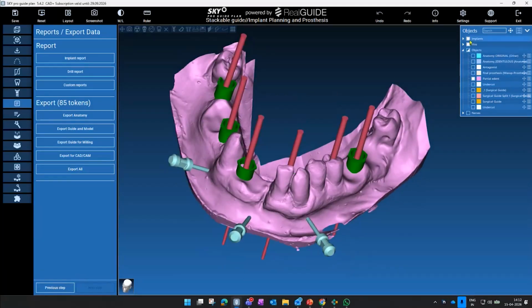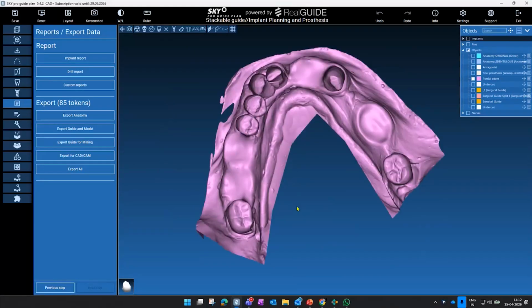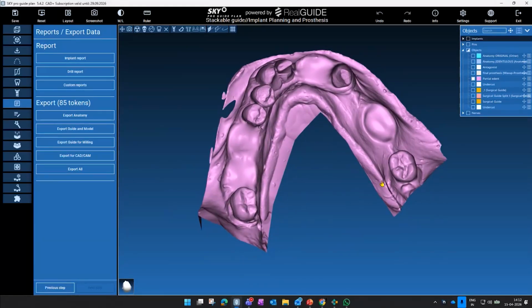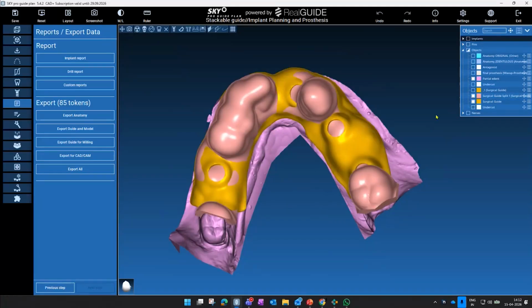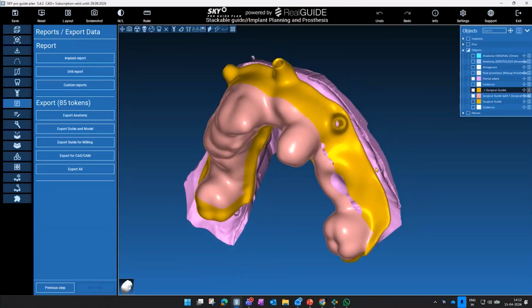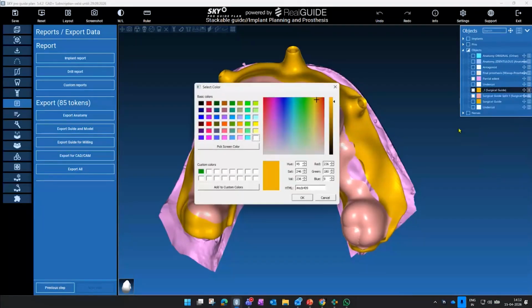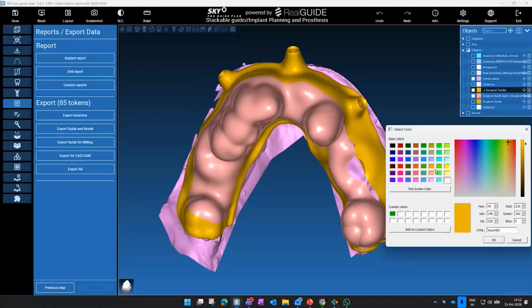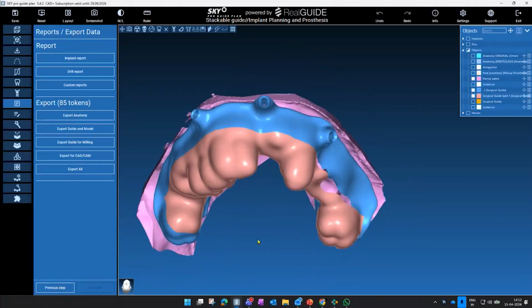So this is how our patient walks in. Now what we do is we place the base guide along with the tooth supported guide. I will change the color of the base guide. Change color, here I have the option. If you see these three lines, I click on this, change color, just so that it's easy for us to understand. I will keep maybe blue. So blue is the base guide and this pink is the tooth supported guide.